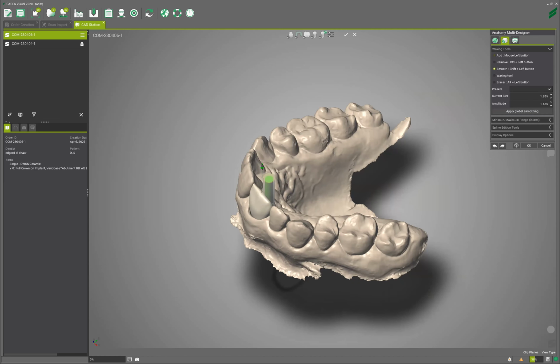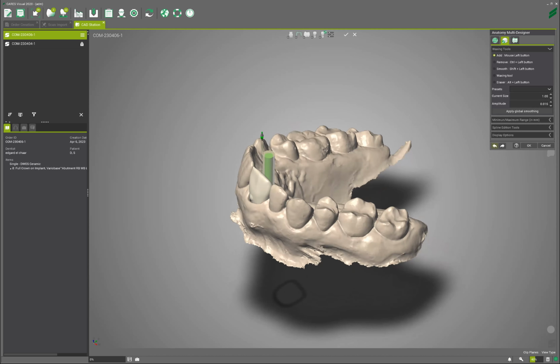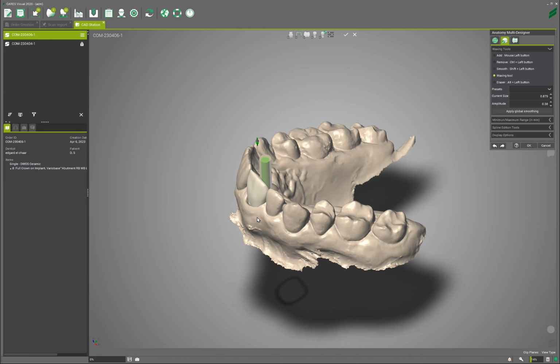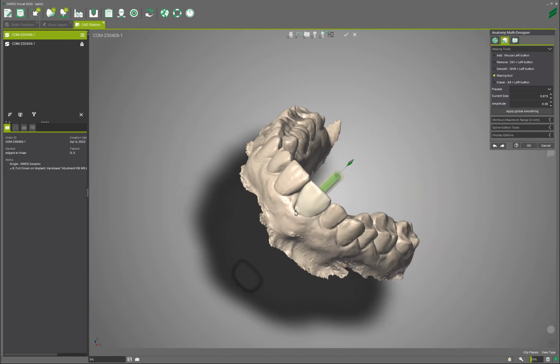And now I'm gonna do this add here. I'm gonna reverse it, and a waxing tool sometimes is much better, but I'm trying to. There you go. Yeah. And again, I want to make sure I'm doing it on the right position.